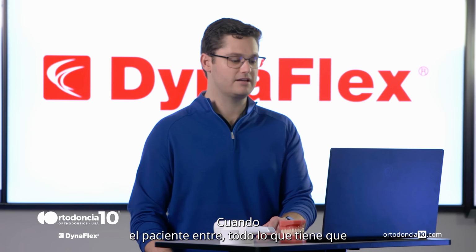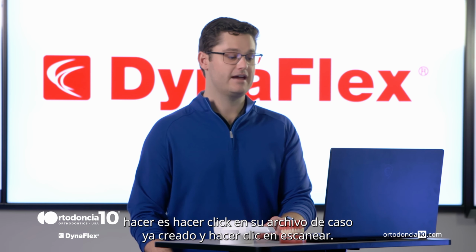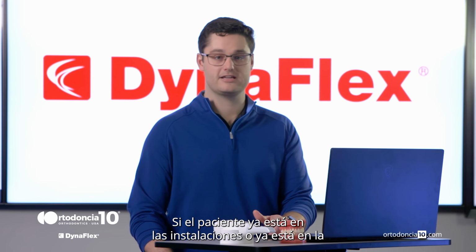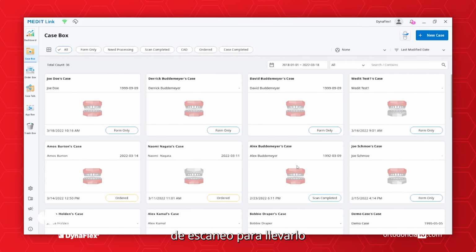When the patient does come in, now all you have to do is click their already created case file and click Scan. If the patient is already in the office or already in the chair, click Register and Scan, and it will immediately open the scanning software to take you to the next page.